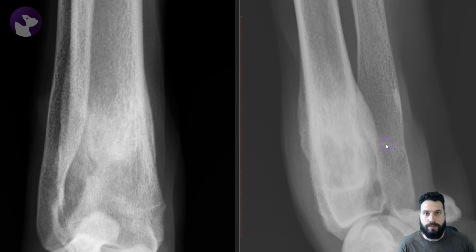Well, I think we can make a little bit of a presumption based on the breed and the location, and this is an osteosarcoma. But what are the features of this radiographically that point to that? Well, remember that aggressive osseous lesions really only need one of our aggressive features to be called aggressive. So this one's on the earlier side.